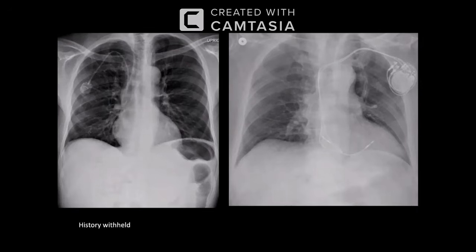It could be a lymph node. Other than that, the paratracheal strip is normal, and there is unfolding of the arch of aorta. And no pneumothorax is seen. Now I'm looking at the bones.